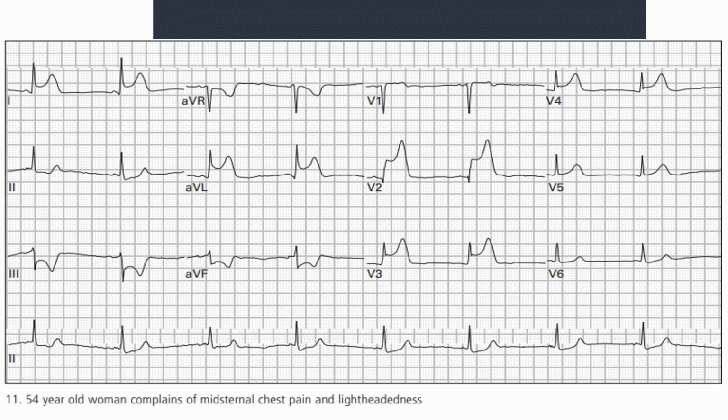It's okay, don't worry. You won't answer wrong. Just answer. This is not a lecture hall. You can rather ask, and then I can tell you why it is or isn't. What we can see is that's the zero line, where there's no electrical activity, like here. The ST should be in line with that. Anything above that line is ST elevation, anything below is ST depression. So these are all ST depressions. We're not stopping there. Now let's look at other things.